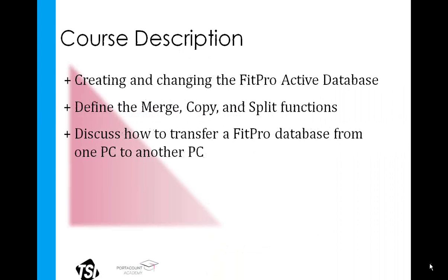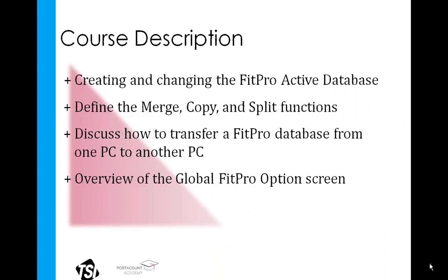This course is going to focus on creating and changing the FitPro active database. We're going to talk about the merge, copy, and split functions, the three functions I find to be the most commonly used. And we're going to discuss how to transfer a FitPro database from one PC to another PC. And then we'll do a brief overview of the Global FitPro Options screen.